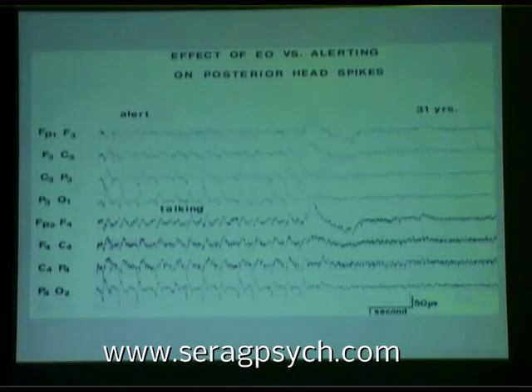Now, here is my tennis coach. His EEG. And my tennis coach has a lesion in the left posterior temporal occipital region. And his seizures can be maximized when he's looking at a tennis ball moving across the court on several rallies. And if a rally is too long, he'll have a seizure.